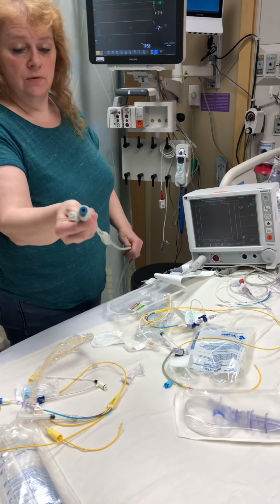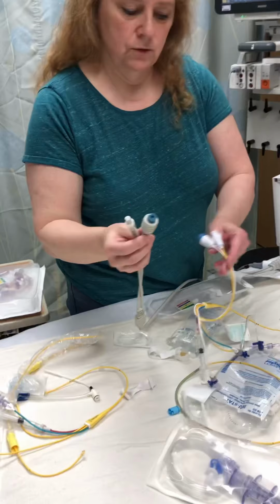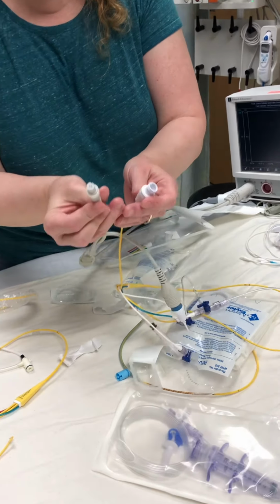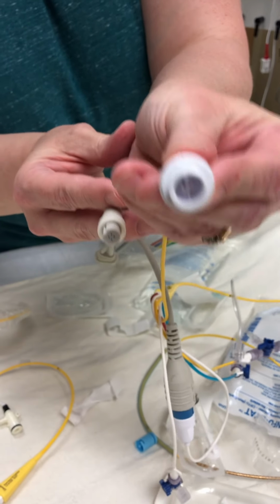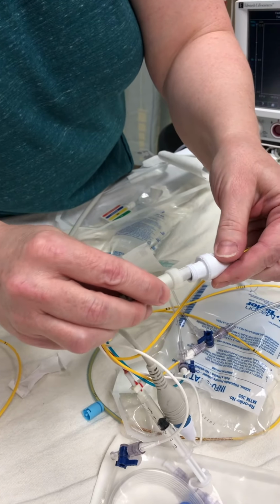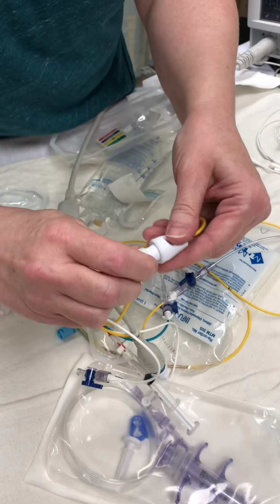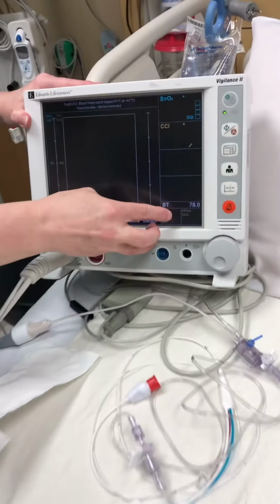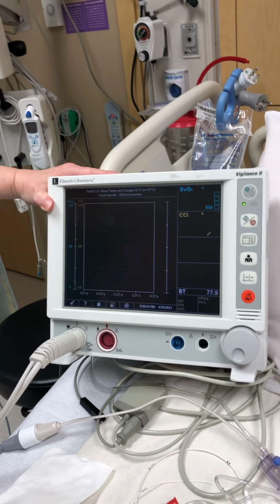this is for the continuous cardiac output, 2 thermistor ports. This one, the blue goes to blue. And with this one, I want you to take a look in there. You have some pretty fragile filaments, and you want to be careful when you're attaching them. Line them up, and then you're going to screw this in. And as you can see, it's showing your blood temp, which is honestly the temperature of the room right now. So that's how you know it works.